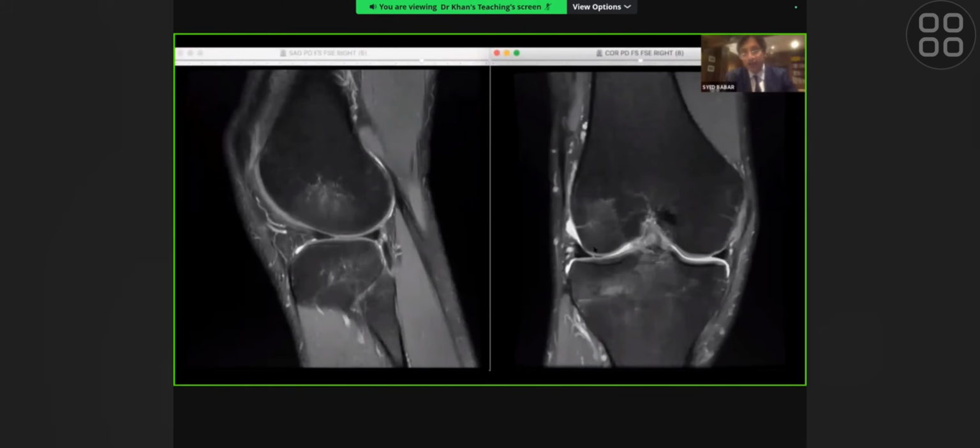And can you see immediately there is a vertical cleft here. Now, this should have been a nice contiguous triangle all the way and then heading back. So there's a clear vertical cleft here of the lateral meniscus. That's again another pointer that there's something going on which is multi-ligamentous, a sort of twisting mechanism injury. Okay, so we've already confirmed one finding.